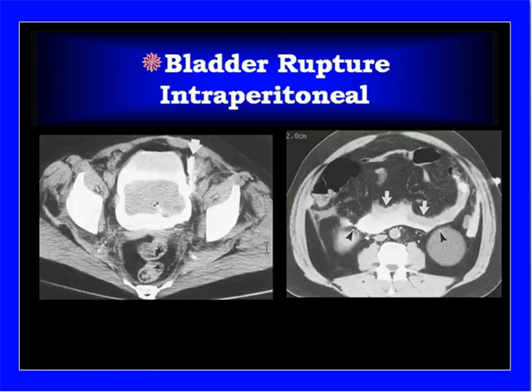Now the first slide you can see is a condition in which trauma may involve the urinary bladder, such as lower abdominal injury in roadside traffic accidents. Here you can see the bladder rupture with intraperitoneal spill of the contrast.